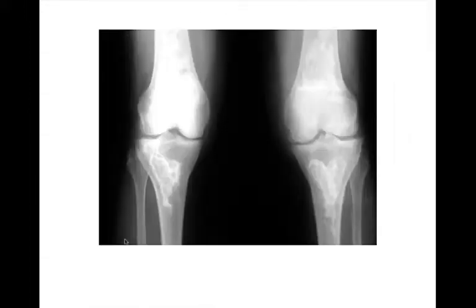Okay, two views of the knee here. This is not a bone tumor in this case, but something that can mimic a bone tumor. Here you have these sclerotic serpentine lines in the proximal tibias and distal femurs. Sorry, this is artifactual here, kind of blown out. But these were bone infarcts.